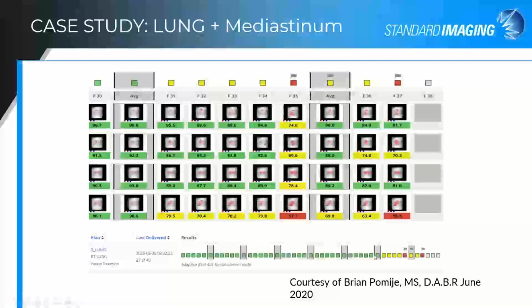And you can see that things were going well until we got to these last 2 weeks of treatment, and then things started to fall off the cliff. And if you look at some of this temporal information, you can see that indeed on certain days things are looking worse than others, and then you get to the point that some of these actually start to fill basically the whole treatment area, and some of these are a little worse than others. It could be related to setup, what have you, and the cone beam CT is basically going to answer some of those questions.